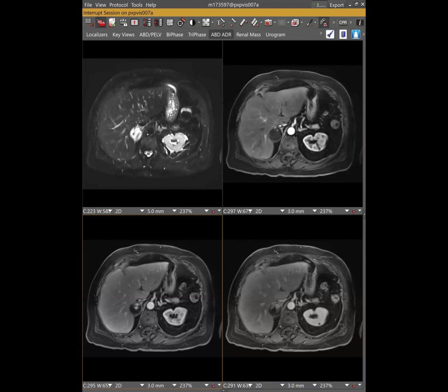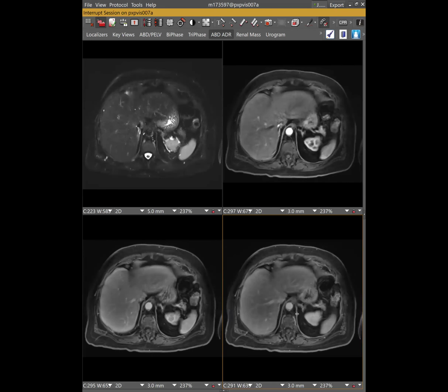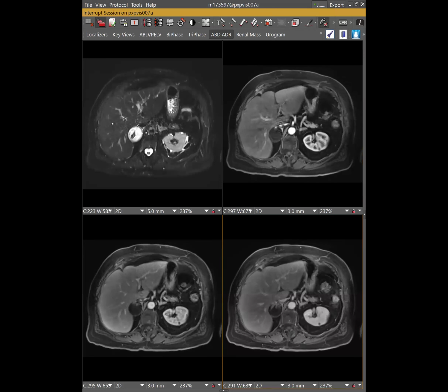here. And it looks like gradually increasing enhancement as we get to the more delayed phases. We got our portal venous. Hemangioma. And that's exactly what I thought. I was really hoping this was going to be a hemangioma. Did not come back as a hemangioma, which was shocking. We have even a CT here, which I will show. Pheo. Didn't come back as a pheo either.